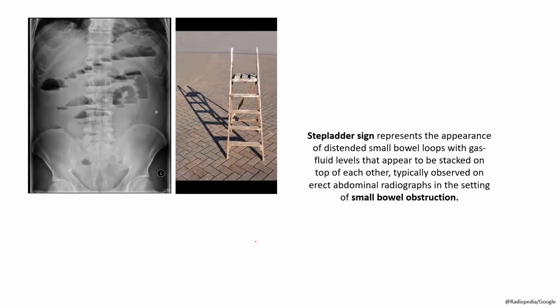What is happening in this abdominal radiograph? In the erect abdominal radiograph, we are finding multiple fluid levels giving step ladder sign or string of pearls sign, and it indicates mechanical small bowel obstruction.